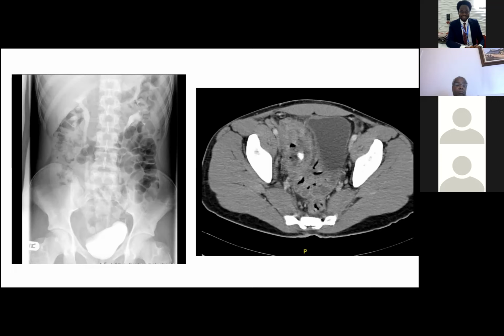So finally, the patient went on to have a CT scan, on the right there. Is anybody comfortable making any comments about the CT scan? That CT scan was performed following intravenous contrast medium. This is a transverse or axial section through the pelvis. You can just about make out the top of the hips on that CT scan. Any comments about the CT scan?